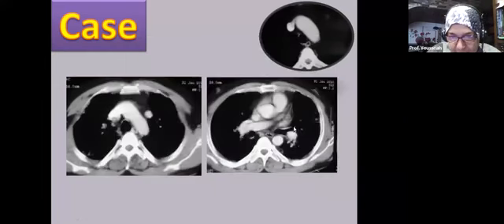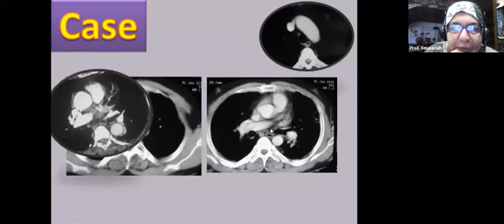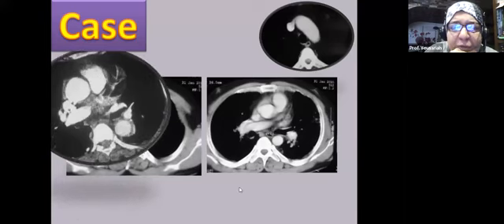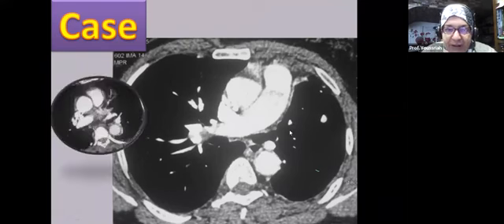Following this downwards to the hilum, we see the missing of the left superior pulmonary vein in its normal site. On the left side, this is what we have seen before. It should be normal. We don't see it here. Now, in another case, which is more clear here, we see this is the upper lobe bronchus with the pulmonary artery branch behind and no pulmonary vein in front. Again, this is a sign of anomalous venous drainage on the left.